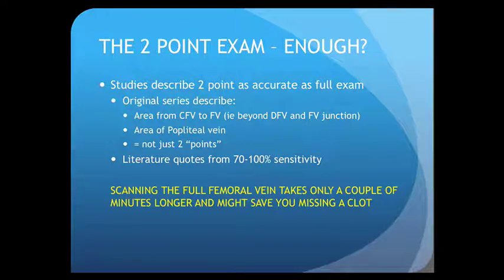Now, putting the ultrasound exam in context, there are a number of controversies that I think are worth discussing. The first of these is that you'll hear a lot of people talk about the two-point exam. And people describe this as you put the probe on at the groin crease and look for compression, and then you put it behind the knee and you look for compression, and you don't need to do anything else. It's a very quick exam, obviously, and technically it's quite simple to do.